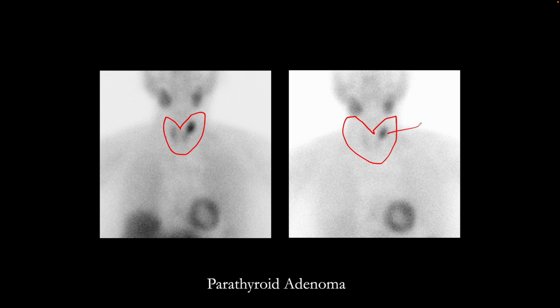Here is our next patient. Also looks like a parathyroid scan where we have early images showing uptake in the thyroid and asymmetric focal uptake at the superior pole of the left lobe of the thyroid, and the delayed image acquired up to 2 hours later after the administration of technetium-labeled Sestamibi. The uptake in the thyroid has washed out. Focal uptake persists at the superior pole of the left lobe of thyroid, consistent with the parathyroid adenoma.